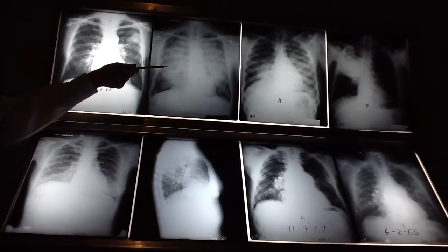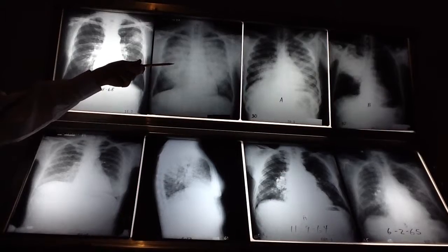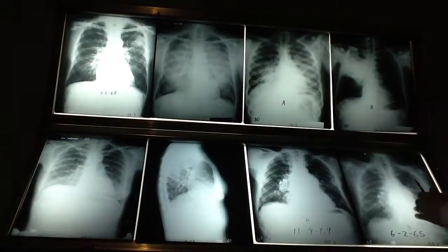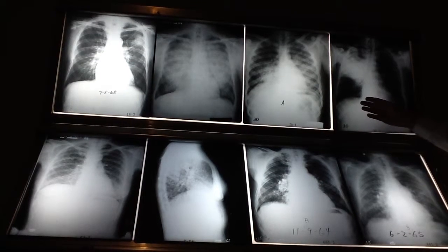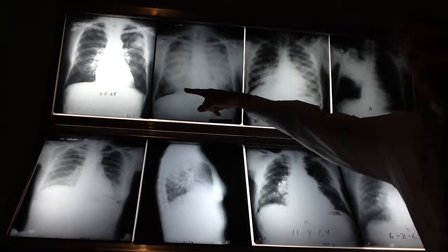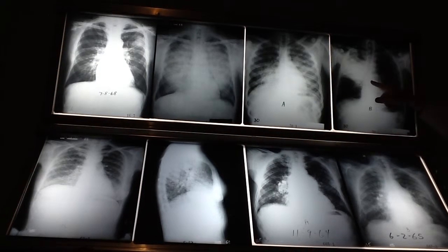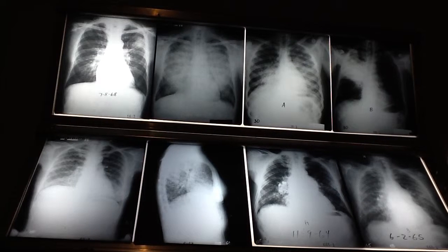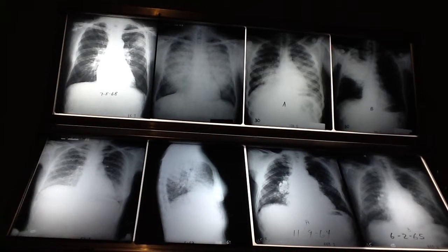And that's a lot of air volume to lose. It's going to have major dyspnea. Now, this one here. Also two different examples. Look at this one and compare to that one. That would be more segmental. Yes, this is segmental. And probably multi-segmental, but not lobar.